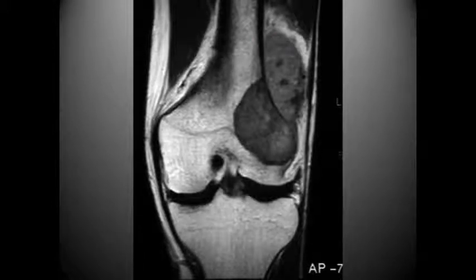Here's another osteosarcoma, and we notice some soft tissue changes here as well. And notice that we still do see a growth plate here. On this image, we notice something in the distal femur.